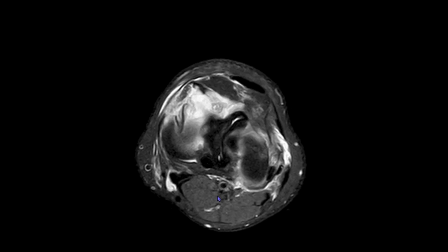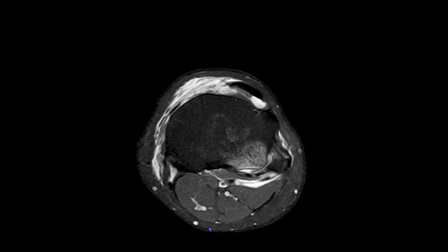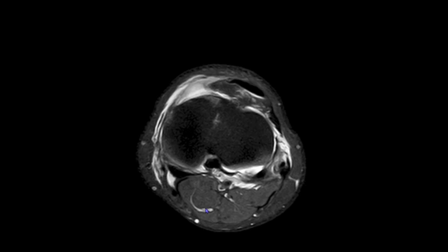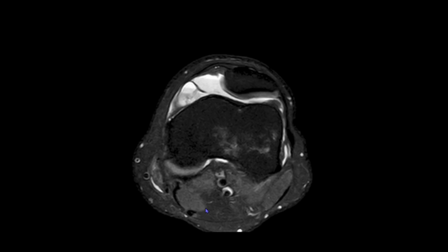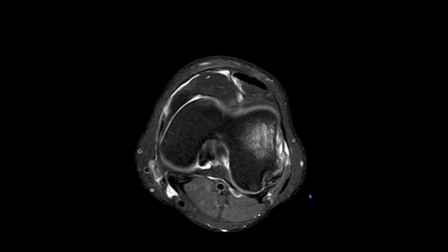On the medial aspect, there appears to be some kind of a partial tear going on in the semitendinosus insertional fibers, along with which the fluid is seen tracking all along the posteromedial as well as anteromedial aspect. And we can also see that the joint capsule here appears distended. The posterior aspect of the joint capsule can be traced. This occurs because of the joint effusion.